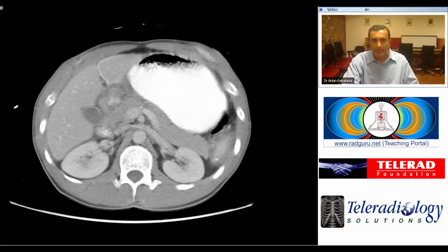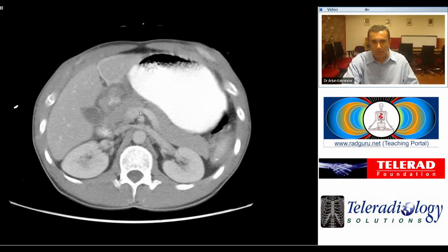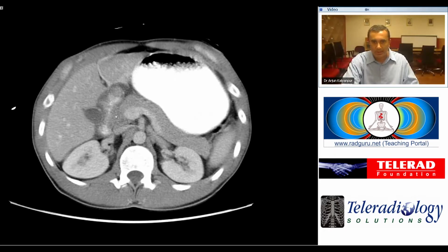And so when we look at the duodenum, we see that there is significant thickening of its wall, with mucosal edema, and the margins are fuzzy. And on this particular image, another thing catches our eye, which is a high density rim around the left lobe of the liver.